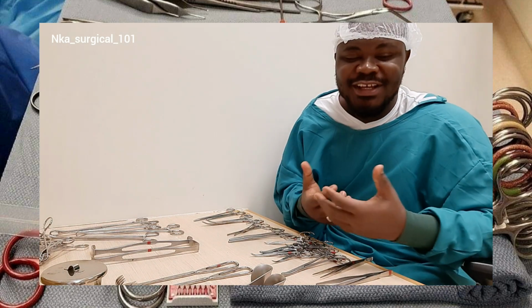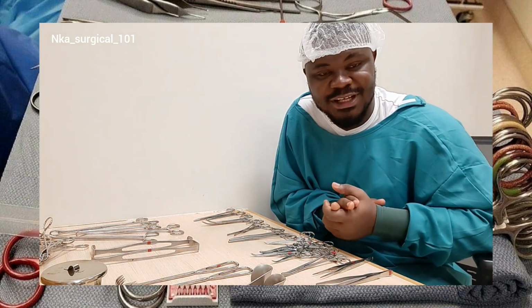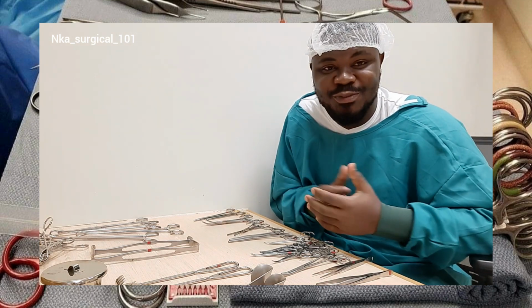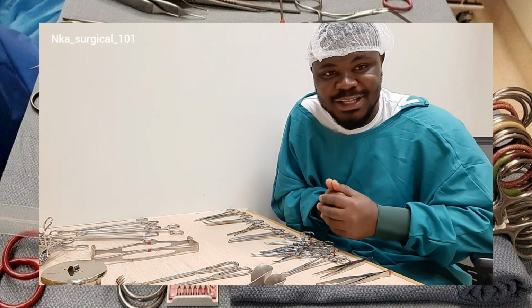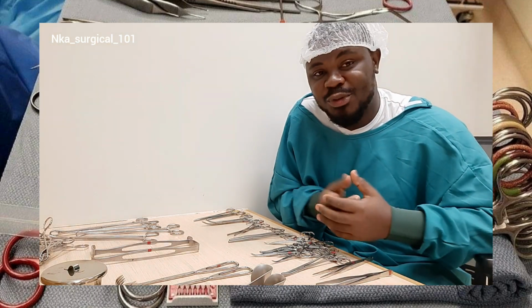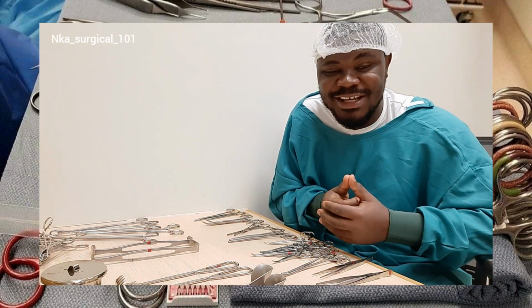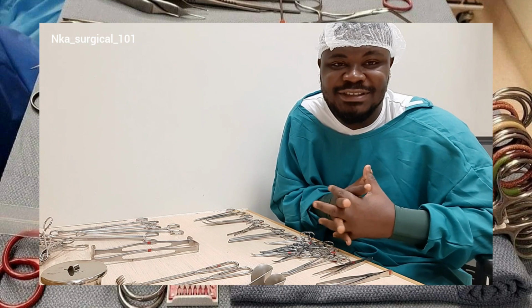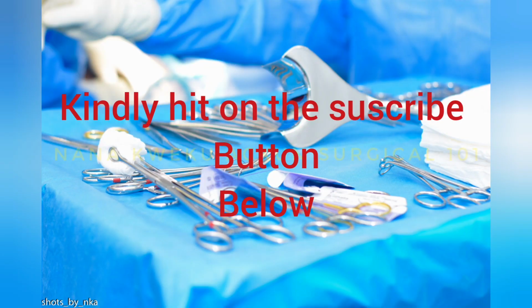The last category of surgical instruments is the accessory or miscellaneous instruments. These are the additional instruments that one way or the other may be needed during surgery. An example is the hammer. Another example is the malleable retractors that are used during surgery. They fall under the miscellaneous category of surgical instruments.